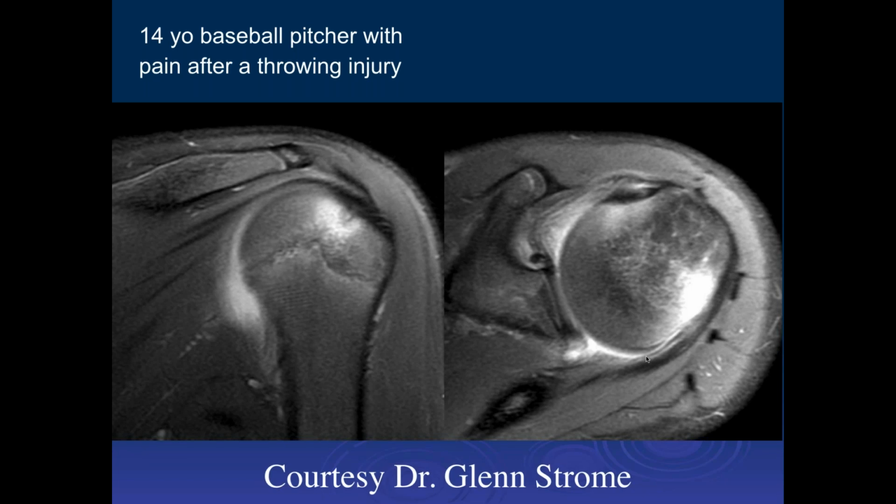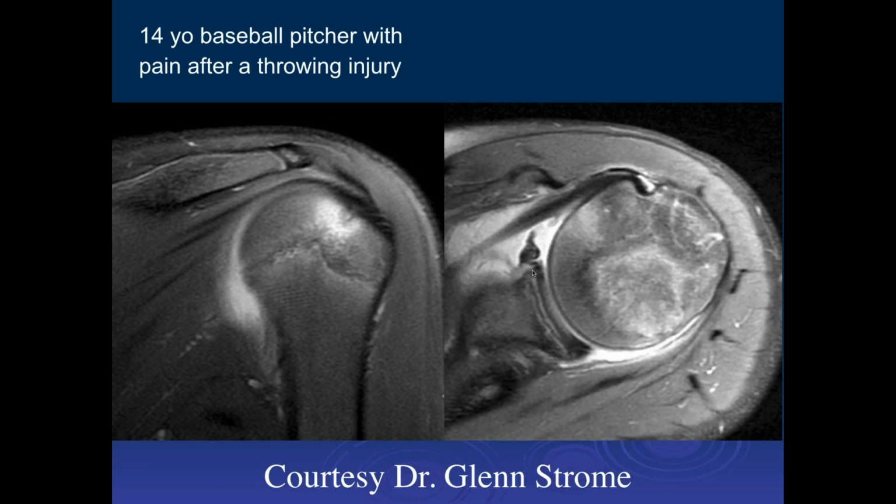I think there are a few findings here. One is the edema in the posterior humeral head, like the posterolateral humeral head. I wonder if there's some. This is pretty far superior, isn't it? Yeah. I wonder if that's a ligament or labrum. I would think probably a ligament anterior to the glenoid, just anterior to the glenoid. Well, that up there I think is the transverse ligament, and that's probably a ligament of some sort. It's probably the middle glenohumeral ligament or something. I don't think it's labrum.